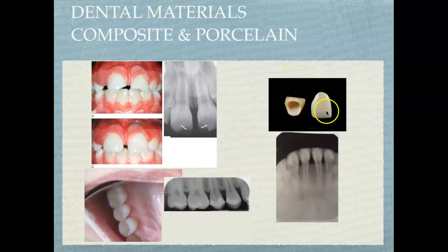Here is a full porcelain crown. Again, somewhat radiopaque for composite here, and also somewhat radiopaque for the porcelain crowns. Again, it's somewhat radiopaque.